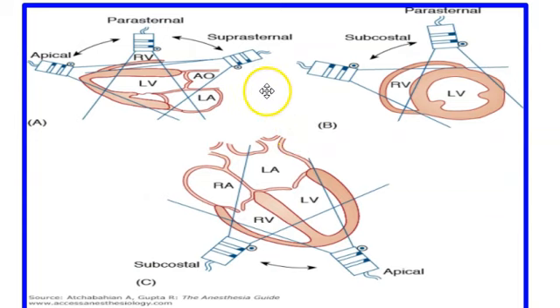We have different, as you guys are learning now, different transducer positioning models to see different areas of the heart, where it shows here parasternal this way, apical kind of down this way, or looking up at the heart this way, and suprasternal kind of looking down at the heart through the aorta. Then you see the short axis and different subcostal cuts and apical cuts here, and this is just giving us an idea of the transducer position and how we see those heart segments.